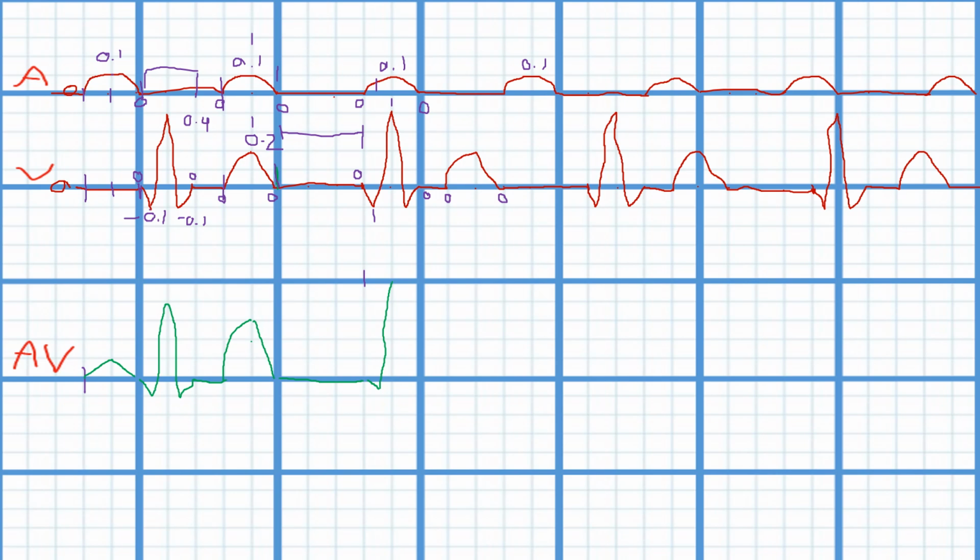What we have going on in this side of the graph is the exact same thing that we have going on over here. And so this is going to go all the way down to half of a millivolt right here. And so we're going back down to 0 because, hey, look, they're both at 0 right here. All right. So over here, we have no electrical activity in this part of the graph right here. So we're just doing a flat line straight across. Nice and boring.